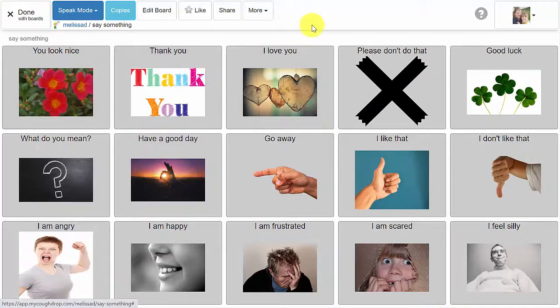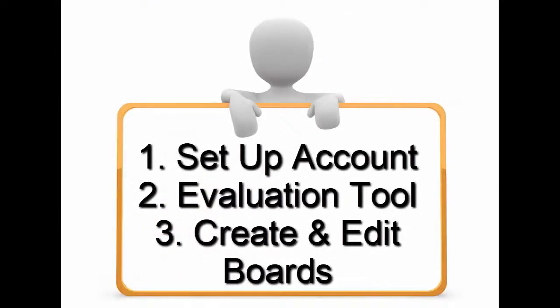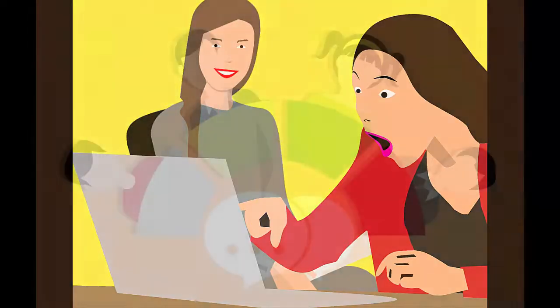Okay, enough already. That should give you the basics. Explore things. Try them out. You may be surprised at all that you can do. Well, there you go. Three main areas that you may use as you get to know the CoughDrop program. Hopefully, this was enough information to help you all ace your assignment and become the most impressive AAC class that Pam Matthew has ever had, and go on to become AAC professionals who change the world through great communication.